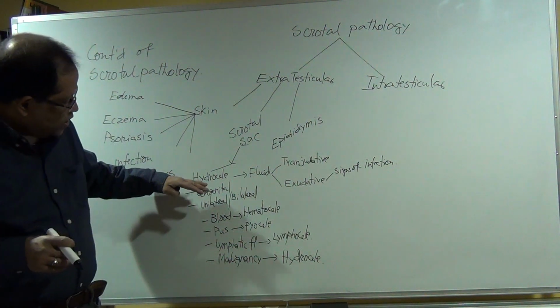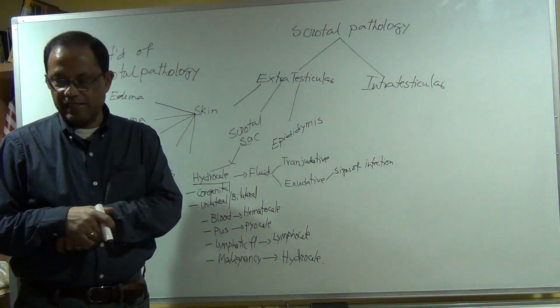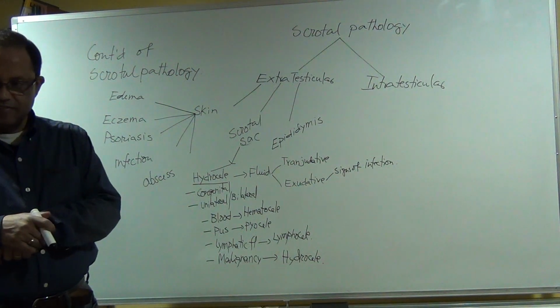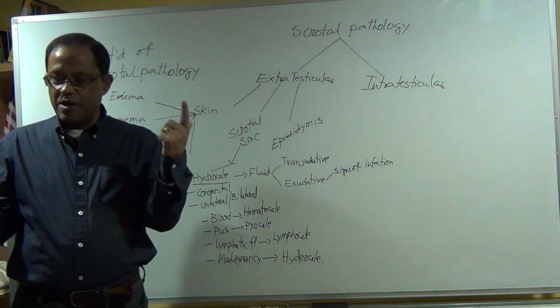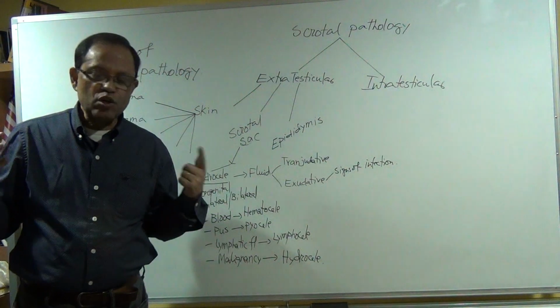Now sonographically, this hydrocele, how does it look like? Sonographic appearance: anechoic or sonolucent.